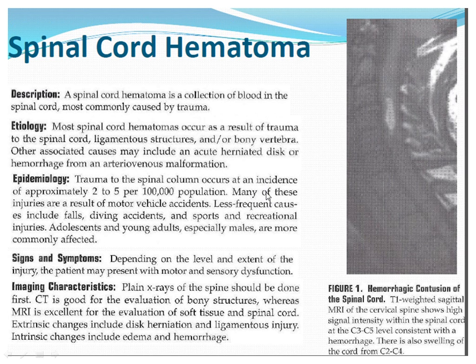So this is a hematoma in the spinal cord. This is a hematoma just like you can have anywhere in the body. You can also have one in the spinal cord. This is going to be a traumatic injury when there's been a really significant force to the whole spine and specifically to the cord. So you're often going to see this with other injuries, other associated abnormalities.